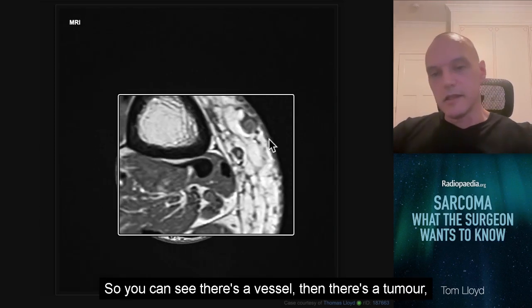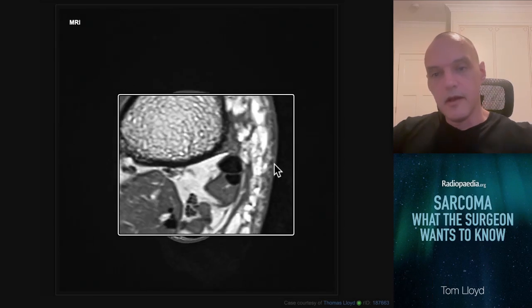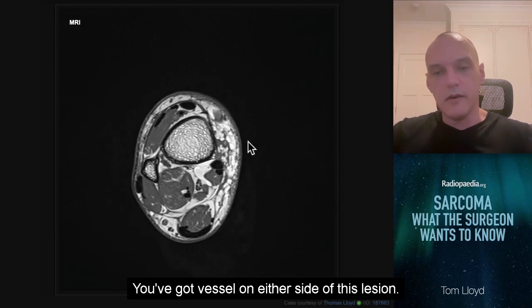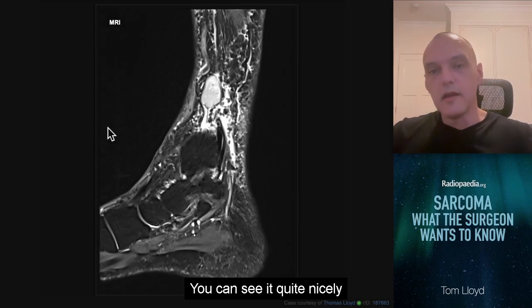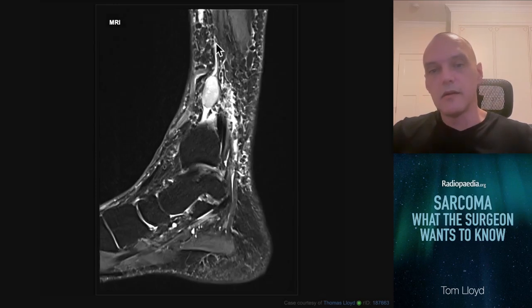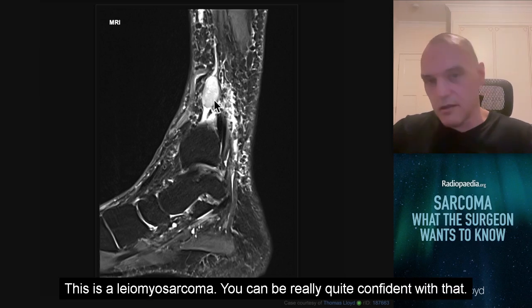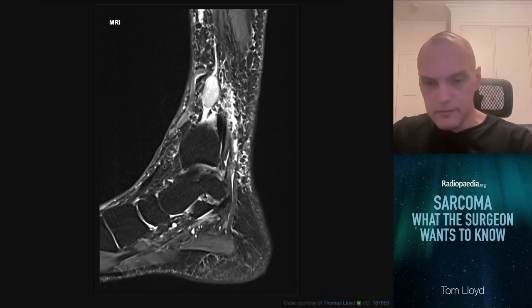So you can see there's a vessel, then there's a tumour, and then the vessel continues. You've got vessel on either side of this lesion. You can see it quite nicely in an orthogonal plane here. This tumour is intimately related to the vessel. This is a leiomyosarcoma. You can be really quite confident with that. You are still going to biopsy it, but you can be very confident with it.